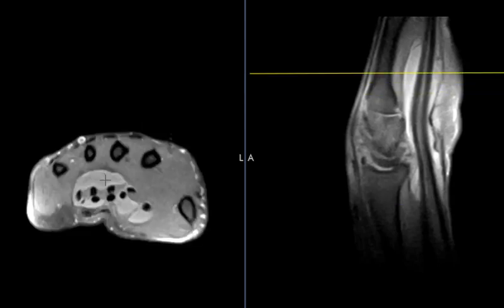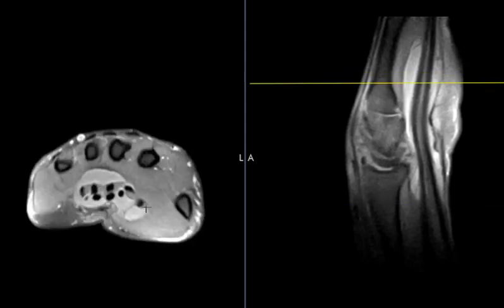So there's a couple bursa in the palm here. One is over on this side here. This is called the radial bursa. And this is the flexor pollicis longus tendon here that goes to the thumb. And there's a bursa here that surrounds this tendon, and it goes all the way up into the thumb. This is our last cut, so we can't see how far up that goes.